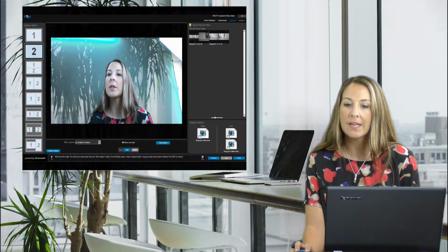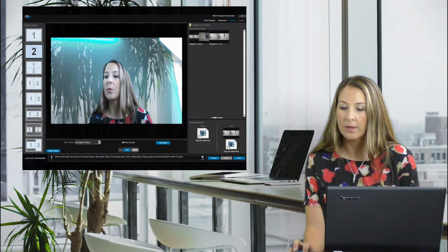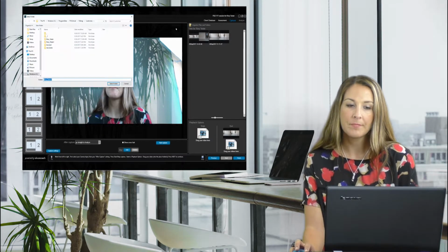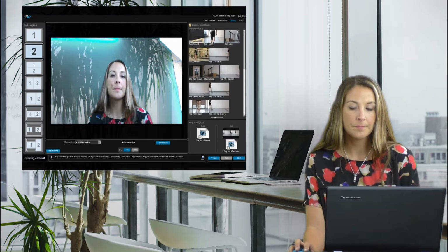So I'm going to take a video that I've actually compiled from the past, which has, oops, that's the wrong one. This one I'm going to use for that one. And then I can go and get my videos from anywhere, which I'll just do right here.